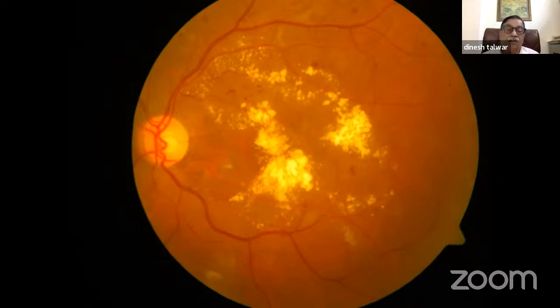Again, in this case also the same thing will apply. Here you have to be careful about the lipid profile of the patient. A person with so much exudation, one thing you have to be worried about is whether his lipid profile is deranged. If the lipid profile is deranged, would you still go ahead with all your treatments? Is there anything else you would do? Would you ask the patient to go to a physician to get some lipid profile treatment done? Yes, sir.